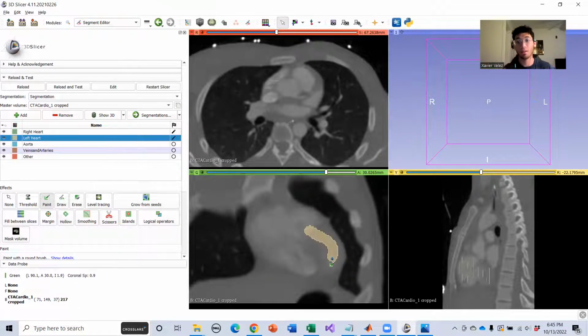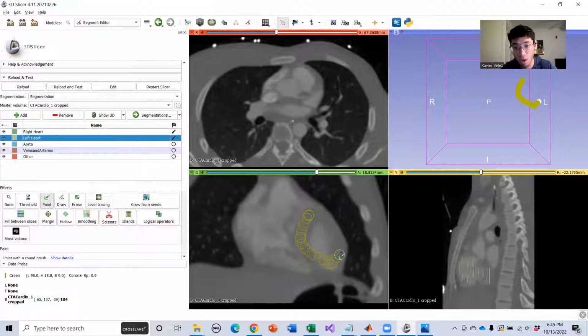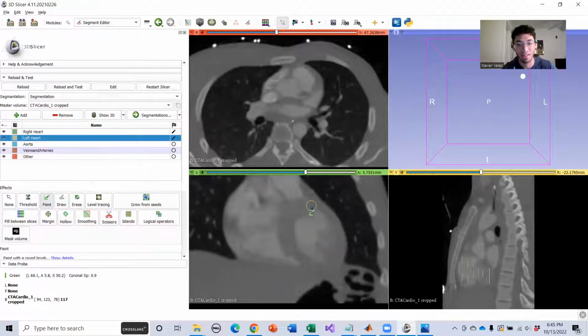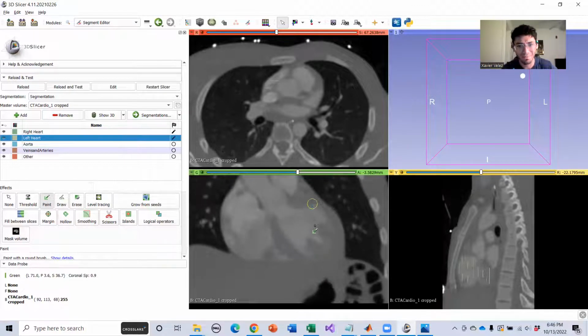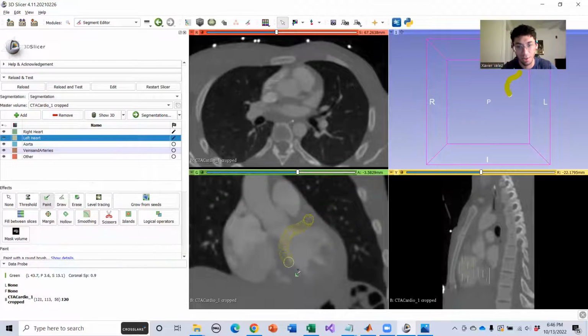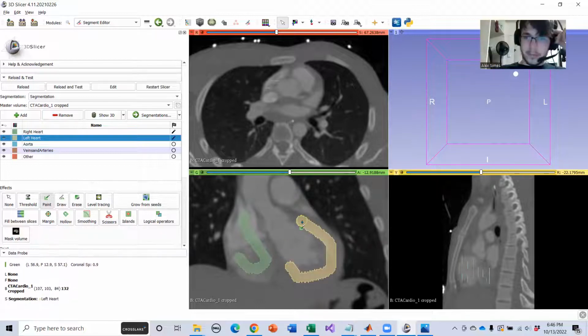And again, especially going into it firsthand, you're probably going to have to look around at this a little bit and experiment with what's what. Because I'm sure right now many of you are just looking at this and going, dude, what on earth? It's a bunch of gray. Where are you getting all of this from? I'd imagine not all of you have anatomy experience, so it might be a little jarring, tricky to see.